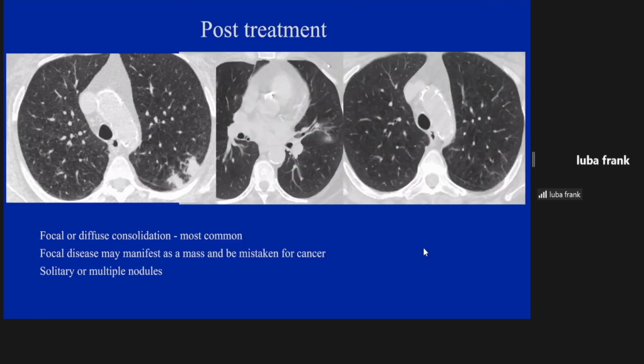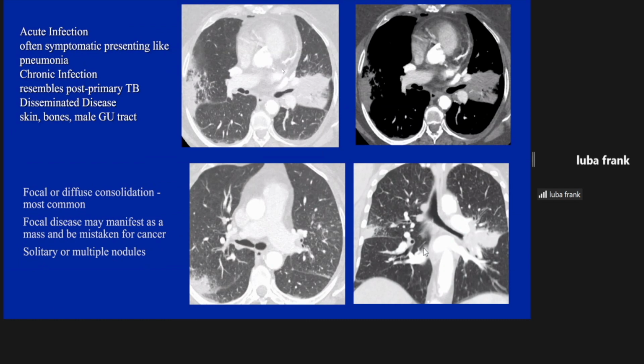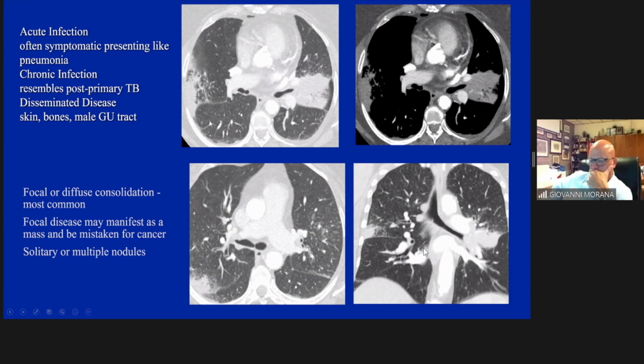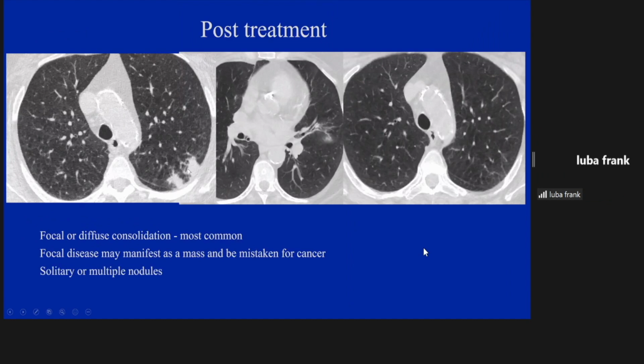So this patient underwent treatment, and I'm just showing you a gradual improvement compared to this very first imaging, these slices, and then gradual improvement with some residual pleural-based, ill-defined, solid pulmonary nodules. The dominant lesion that we saw at the beginning almost went away, and then went away completely or almost completely on the subsequent examinations.